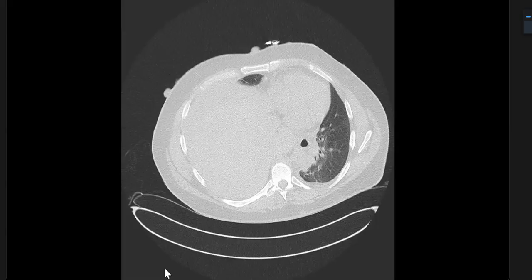Can you scroll it for me, please? Can you scroll it and show me as you're commenting on? No, I cannot scroll it.